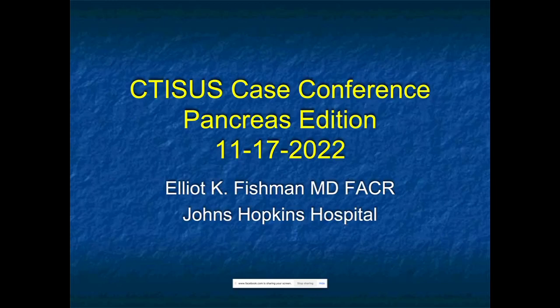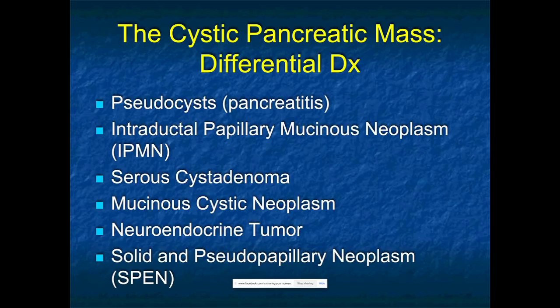So, what I'm going to do is show you a few cases, ask you a few questions, and ask you to give a few answers. Okay, let's get started. Here we go. Just one thing to tell you is I'm going to talk about cystic pancreatic lesions.